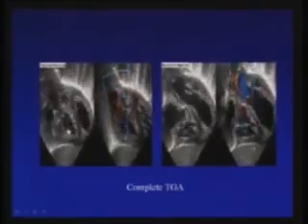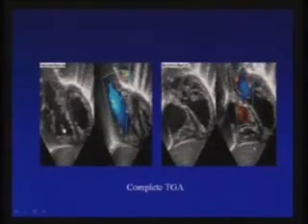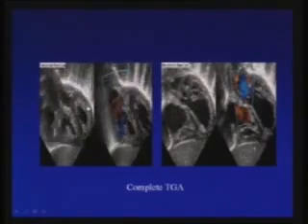From the concordant, this was the AV connection. Then to the outflow sequential analysis, VA concordant we have seen, means aorta arising from the LV, pulmonary artery from the RV. So concordant connection we have seen. Here is the discordant connection.